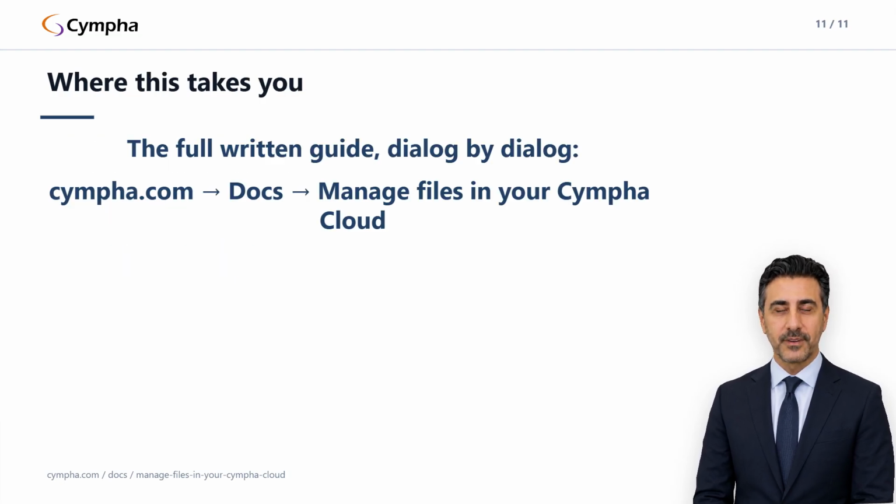You now have an organized private cloud, and it's a launch pad for 3 workflows we cover in their own lectures. You can share any file to a colleague by email, straight from the row menu. You can spin an entire case out of a folder with every file attached automatically. The case form opens pre-seeded, and you only fill in the clinical details. And you can open any viewable file in Cympha Studio right in the browser without attaching it to anything. Each of those has its own written guide and its own lecture in this series.